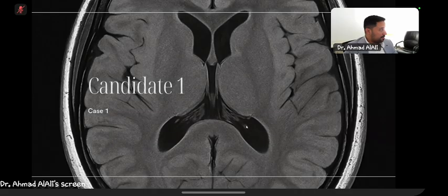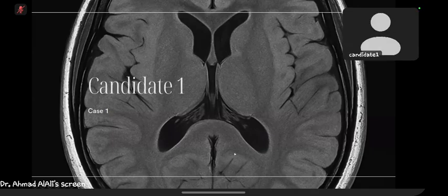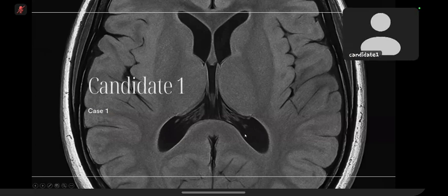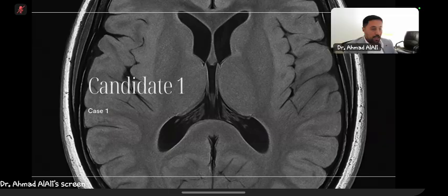Candidate number 1, are you with us? Yes, sir. Good evening, sir. Good evening. How are you doing? Fine, sir. Can you see my screen now, right? Yeah, I can see, sir. MRI brain images are there. Okay, perfect. So I have this patient for you. I will switch the screen so you can start with the case.